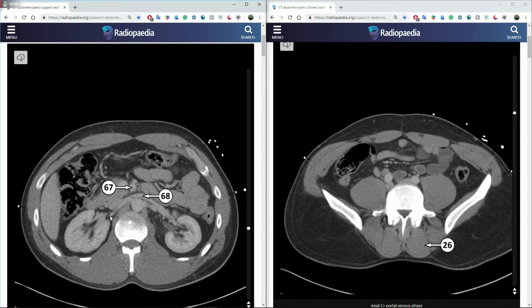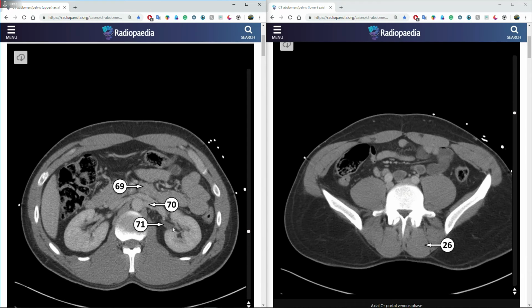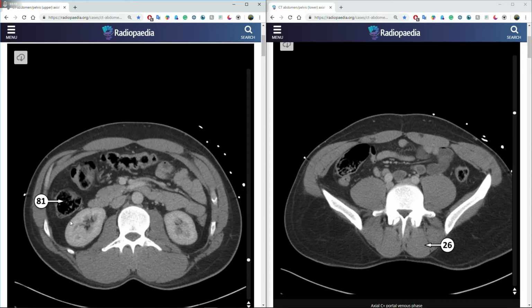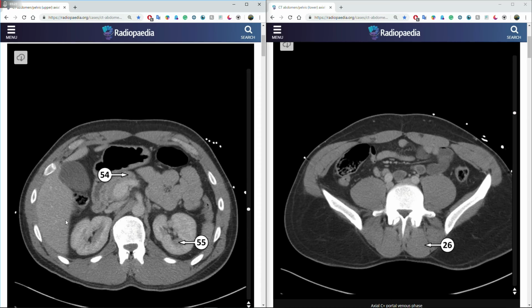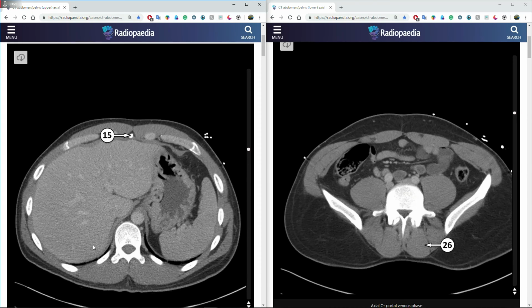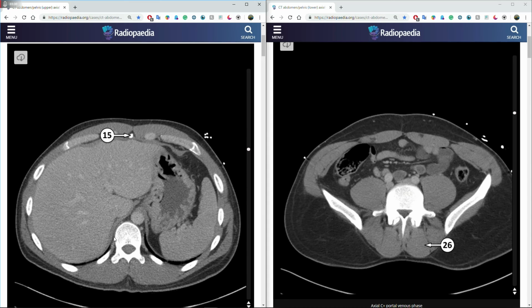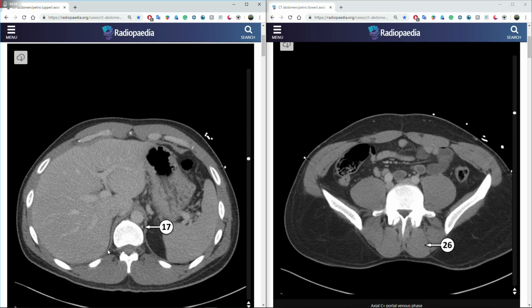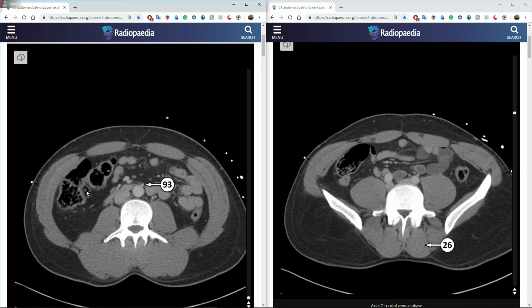Other things to note are the renal pelvis, and the costodiaphragmatic recesses, which are where fluid accumulates in case of pneumonia. That's it for now.